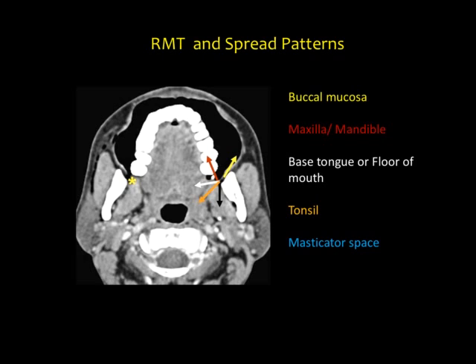Any other? So when we discuss diseases, it may at times be tricky, in that you may see enhancement along the foramens. Remember that certain foramens have normal vascular structures also, and because the malignancy is close to that area, the vascular structures may have feeders which are supplying that tumor, and they can be hyperenhancing. So hyperenhancement or enhancement along the foramen does not always mean perineural disease, but it must be reported.